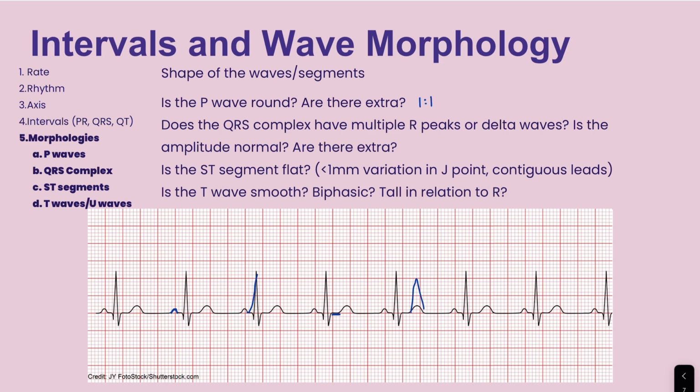These are all things that we want to look at, and it can be challenging because there's no one list that's going to be like a check off of everything you need to look for on an EKG. So what I want you to do is get very comfortable with recognizing what normal looks like. Now, obviously, this example that we have here is a computer generation. So it's the most normal of normal that you could possibly get because it's not even a real person. It's not quite going to look like what your live patients might, right? But that said, this is a very good example of what the most normal of normal can look like.